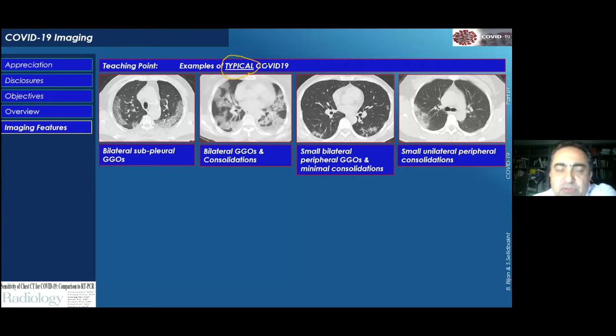For example, if you see an inflamed appendix with appendicolith inside of it, and then a lot of stranding around this thing, the differential diagnosis basically narrows to one thing. It is pathognomonic for appendicitis, or the liver lesion, pathognomonic for hemangioma.